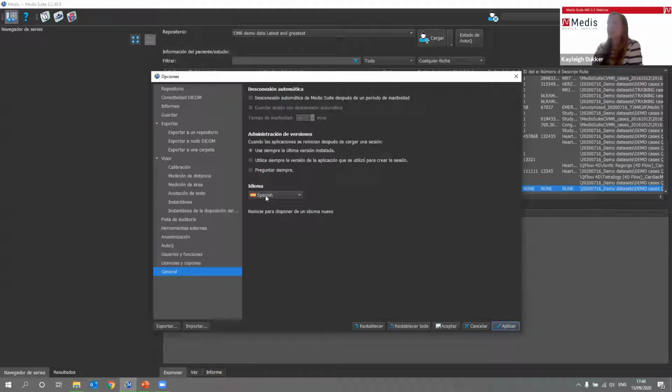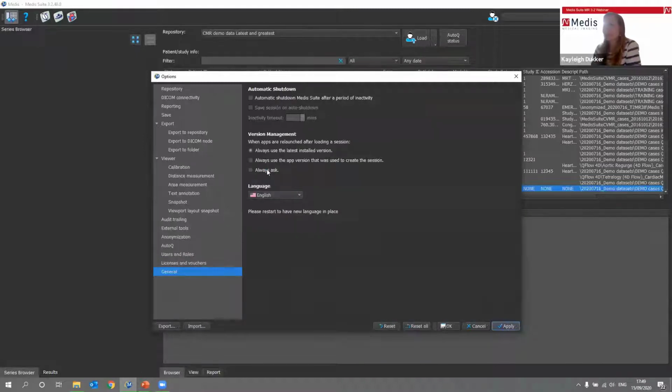So currently it can do the parts that you're seeing, but it might have missed a few fields. And it will be saved on the person. So in theory, only the person who set it to Spanish will see everything in Spanish, and the one still preferring English will keep it in English. So let's move it back before I don't understand what I'm doing anymore.